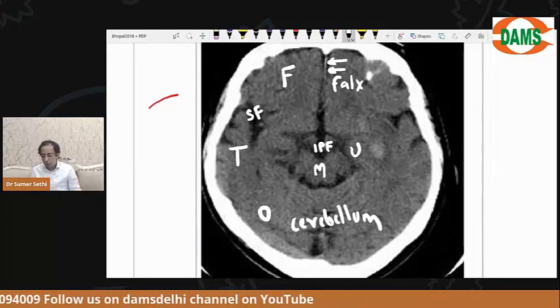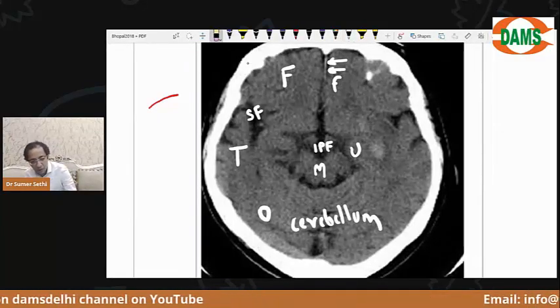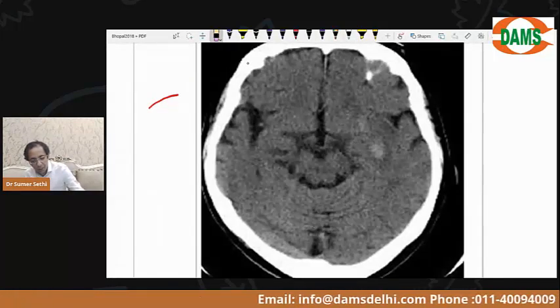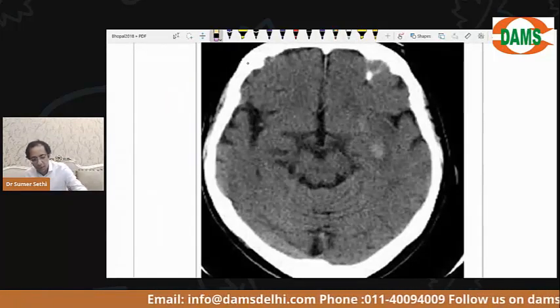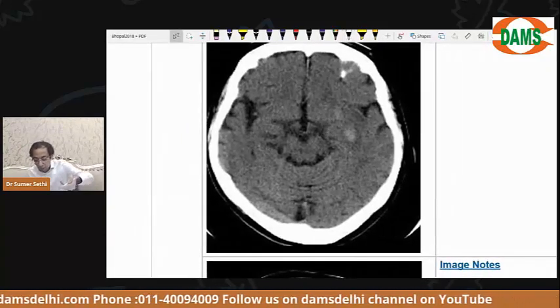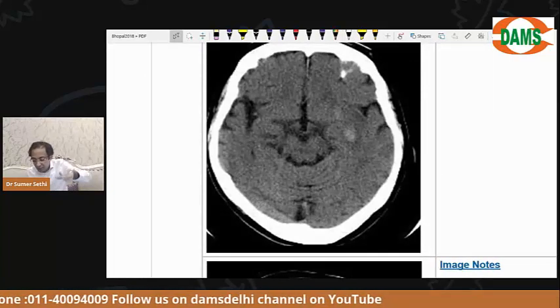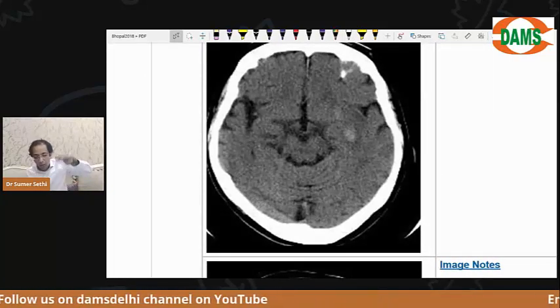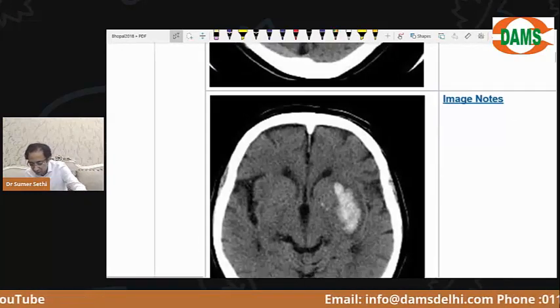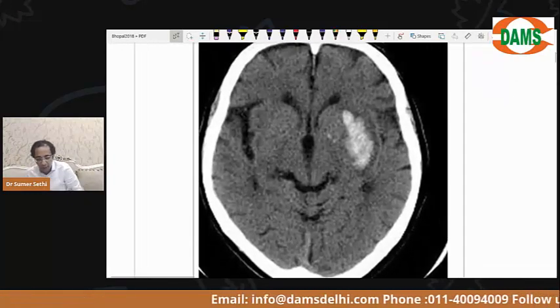Everybody clear? Okay. So this was the anatomy on this section. We call it cortical blindness with macular sparing, which happens in uncal herniation. Now, once you are clear, let's go up. Can you see, at every section I'm trying to go up and up and up. So you could have taken this image if you want to. That is okay. We have shown you this image multiple times.